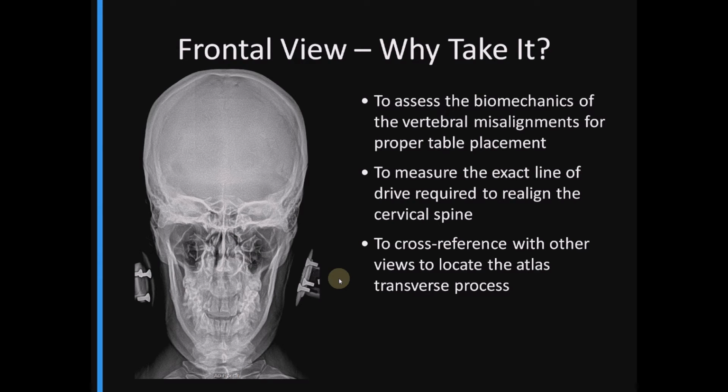It is also intriguing to think about that on the frontal view, as well as the horizontal view and sagittal, we're going to be measuring the patient's genetic anomalies and uniquenesses in their upper cervical spine as well.